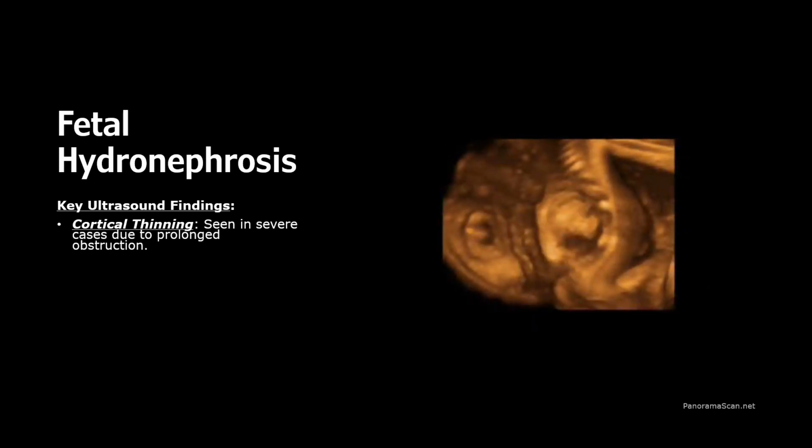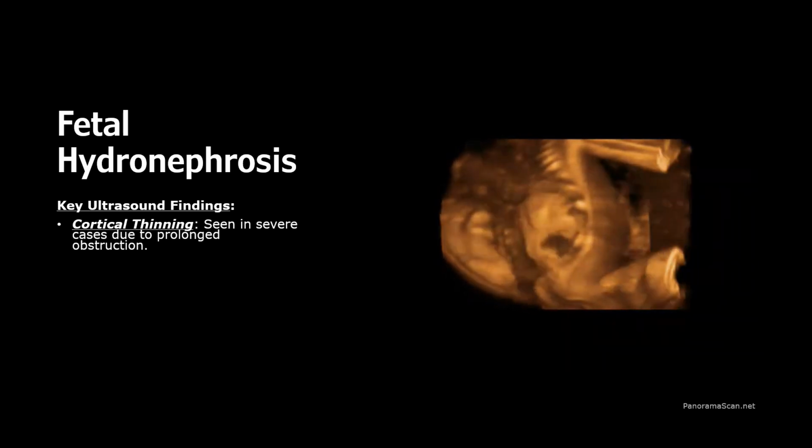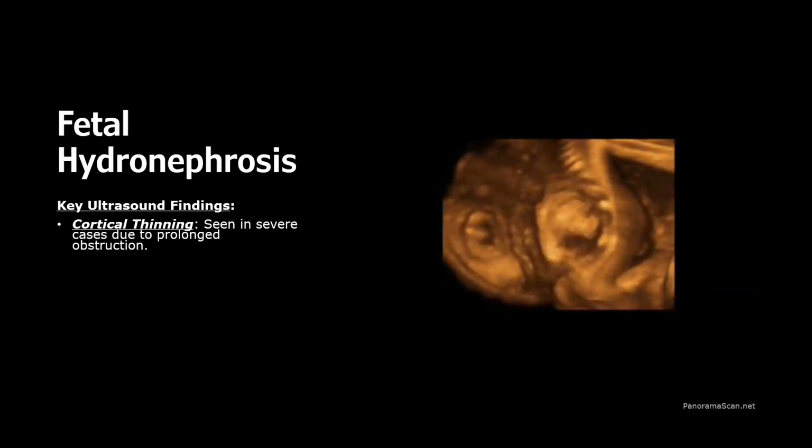It is essential to evaluate the bladder, especially in cases where obstruction is suspected. Posterior urethral valve, which is a common cause of obstructive hydronephrosis, may cause a distinctive keyhole sign. This is seen when there is a distended bladder and a dilated posterior urethra. The keyhole appearance is a classic ultrasound finding in male fetuses with PUV, and it warrants further investigation and management.